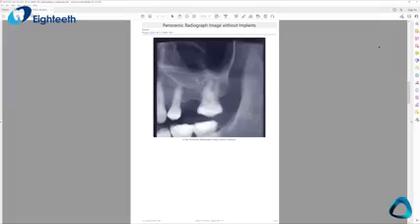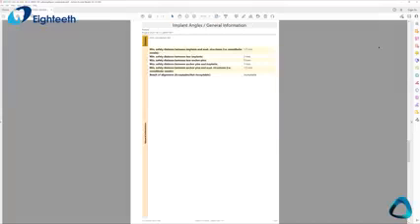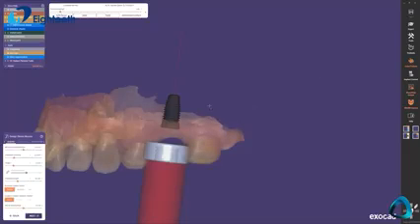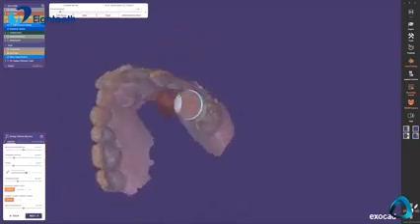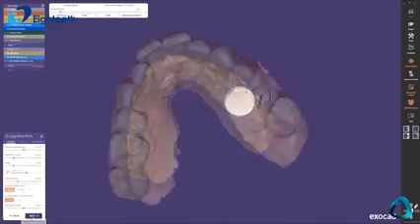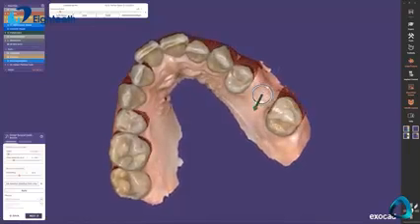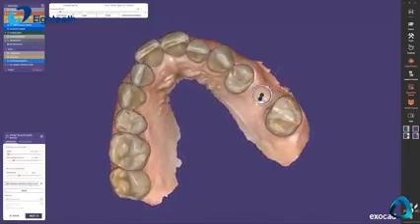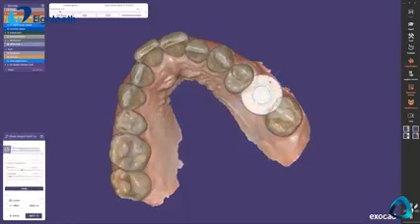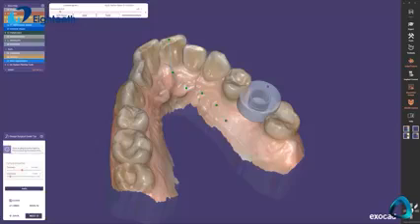Next, you generate the implant planning result files, and now you're ready to move on to the next step, designing the surgical guide. In Exocad, when designing the surgical guide, you first create the sleeve mounts that will hold the metal sleeves I mentioned prior. Then you prepare the fitting surface of the surgical guide. This is called the surgical guide bottom. You want to ensure an accurate and snug fit without causing issues with undercuts.